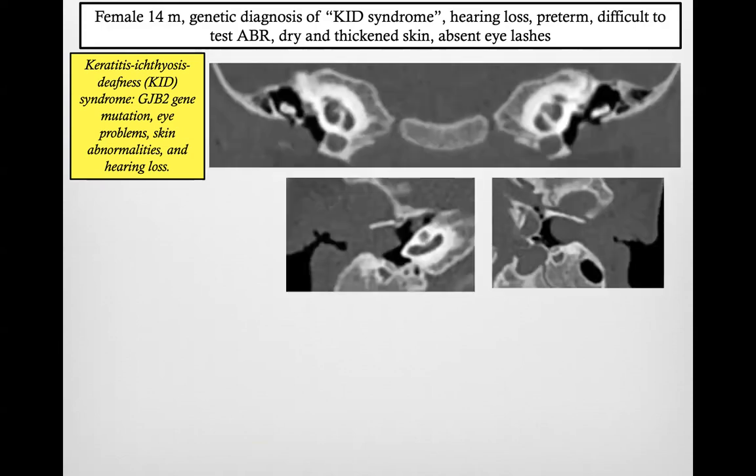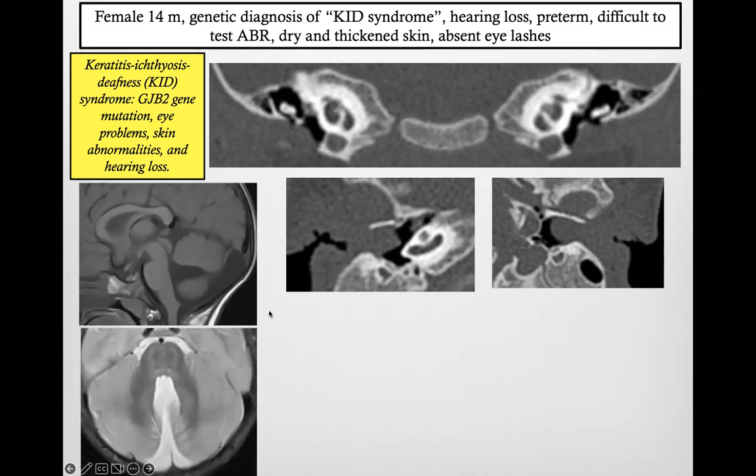Look at this case. Again, very small tympanic membrane. Inner ear looks normal, but look, there is soft tissue in the external ear. So now I told you that conductive hearing loss is all the way from the pinna to the oval window. In this specific case, we have external auditory canal opacification with soft tissue, and also malformation of the posterior fossa that are probably related to the syndrome.